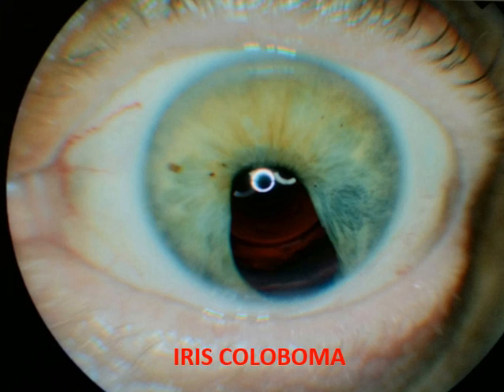The other reason why this iris can appear like this is if there is any obvious history of injury to the eye. We can't see any obvious corneal or scleral scars, so this is iris coloboma with pseudophakia, that is posterior chamber intraocular lens.